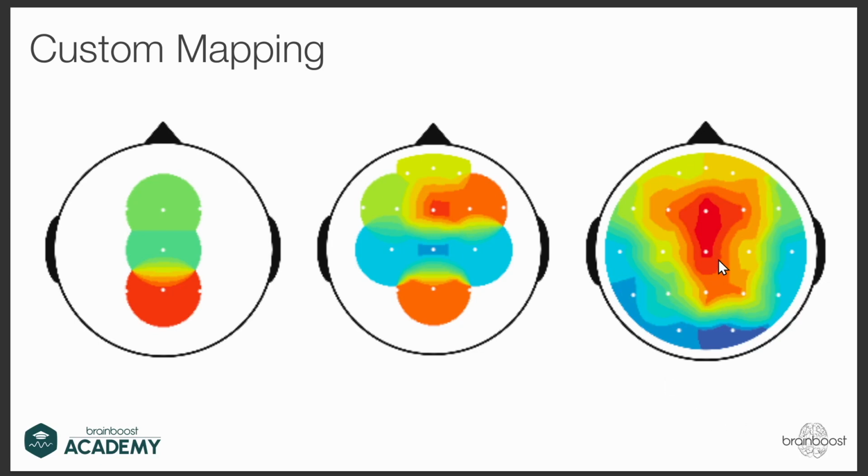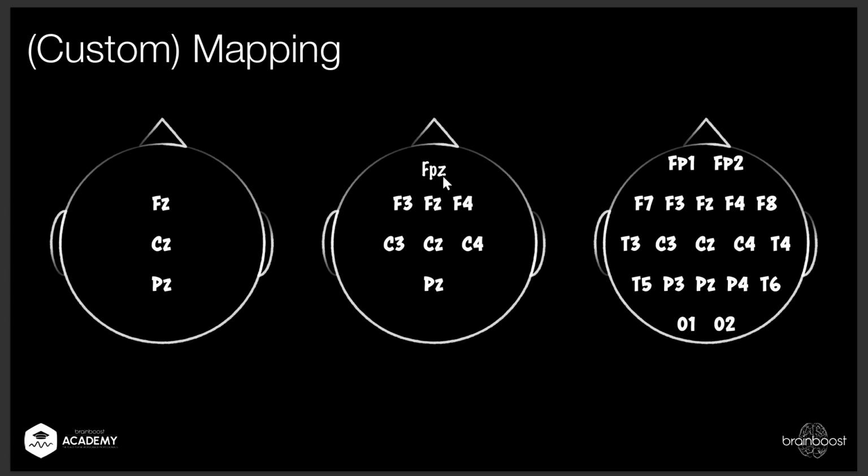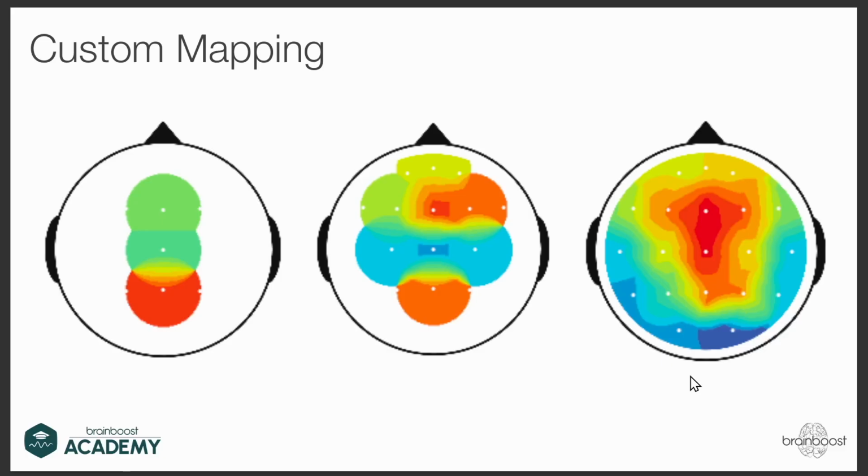So what we see is, if you have the full 19 or 24 or even more channel cap, then of course you have these very fine thin layers, and these nice shades. Whereas a very intense area shows red or warm colors. If you have 8 channels with this mapping, and you place them differently, then you have other positions. Then of course you can also see quite some nice things. It's not as detailed as this one.